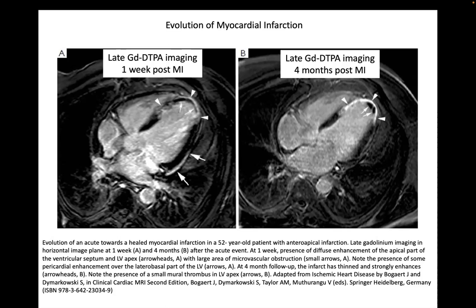Okay, so here, this shows again the late gadolinium enhancement for infarcted tissue, right? And the interesting thing about this example is that they can demonstrate in this patient how this changes over time.